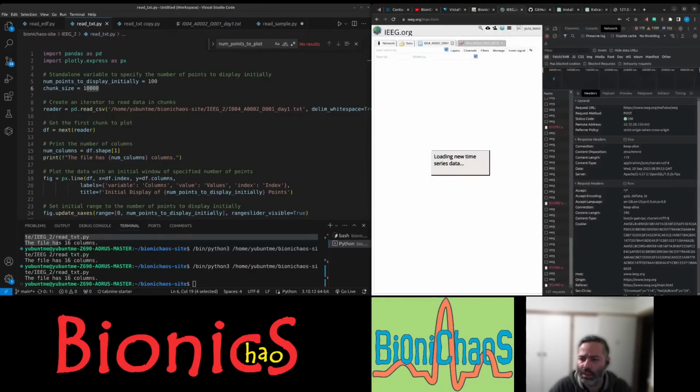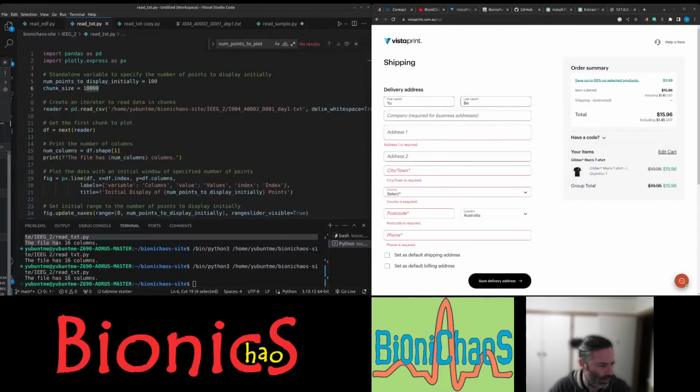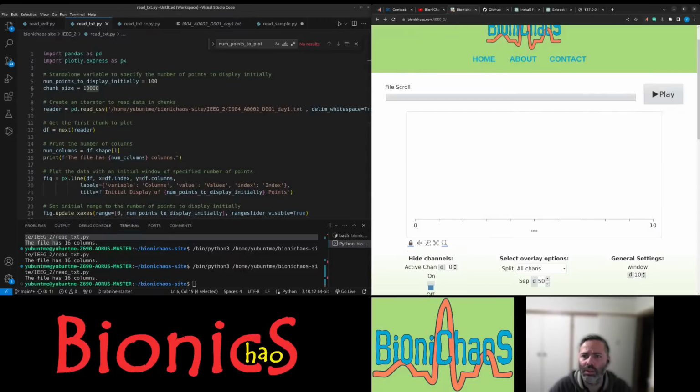This one's still loading stuff. It's crazy. I need to log in again or something. I think it's getting some errors maybe. Yeah, I think it's getting a lot of errors.